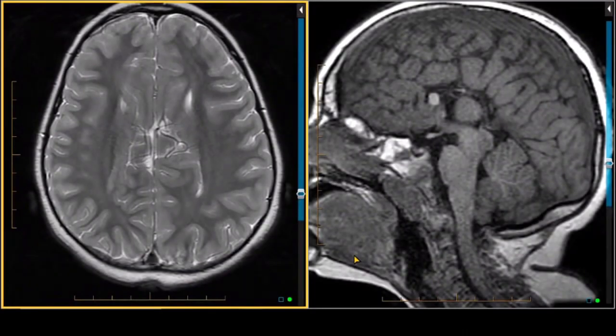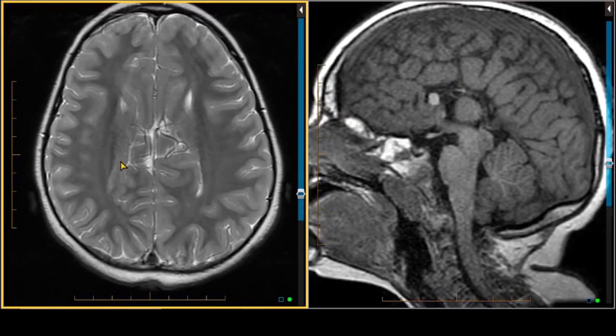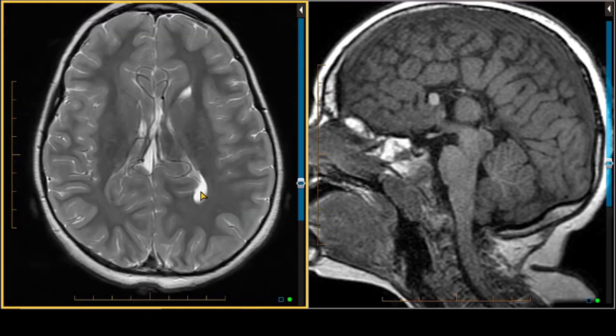This is an MRI of a child who's 5.5 years old with developmental delay. And if we look at the mid-sagittal T1 weighted imaging, we're not seeing what looks like a normal corpus callosum, similar to the patients with the agenesis of the corpus callosum, which we saw before. We have a parallel appearance of the body of the lateral ventricles, and we have mild enlargement of the atria and occipital horns of both lateral ventricles, left greater than right, sort of a milder version of colpocephaly than in some of the other cases that we've seen.